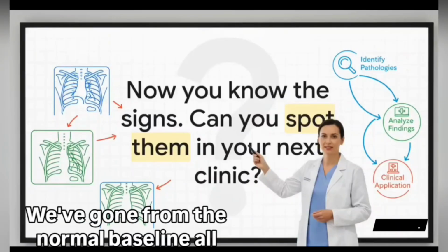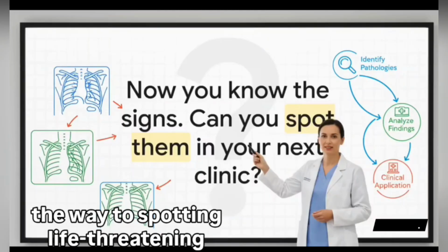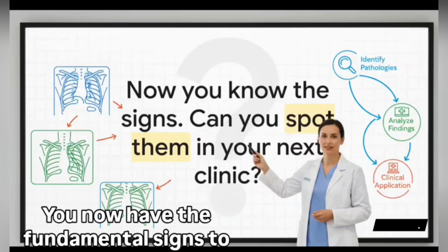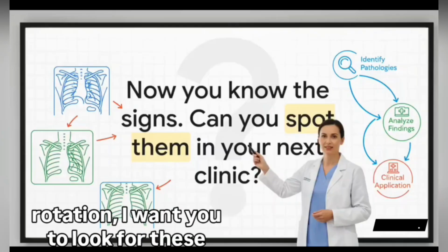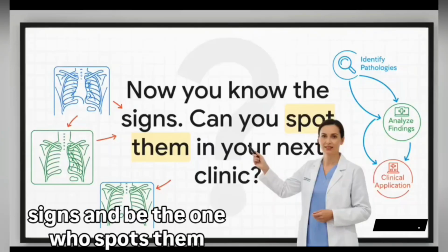And there you have it. We've gone from the normal baseline all the way to spotting life-threatening conditions. You now have the fundamental signs to confidently look at these chest x-rays. So the next time you're on your clinical rotation, I want you to look for these signs and be the one who spots them first.